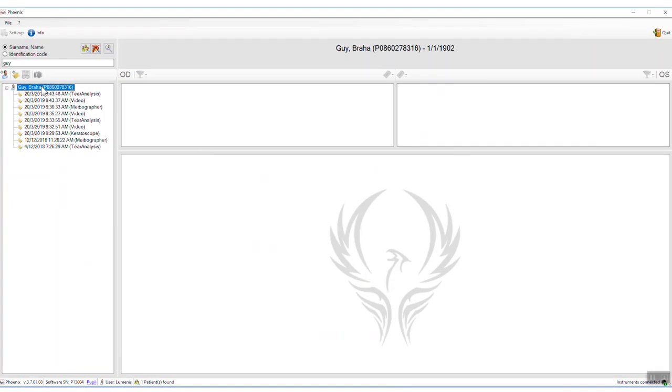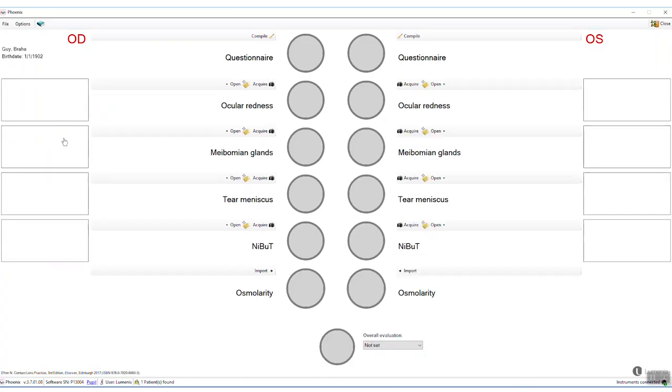Welcome to the Lumenis Training program, where today we are going to show the brand new update of the dry eye report. We're going to choose the patient's name. We do a right click and go straight into the bottom where it says dry eye report. This dry eye report is going to streamline your workflow.